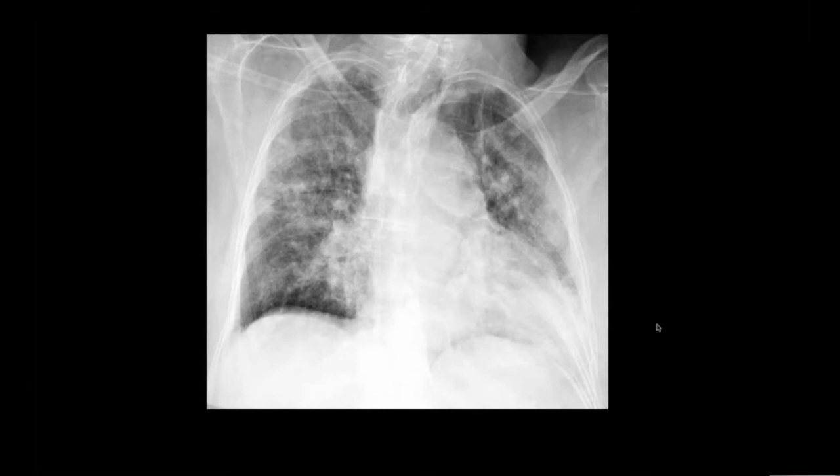This chest X-ray shows multiple patchy airspace consolidations in both lungs. Some of them have nodular appearances. So these are imaging findings of bronchopneumonia, or diffuse bronchopneumonia.